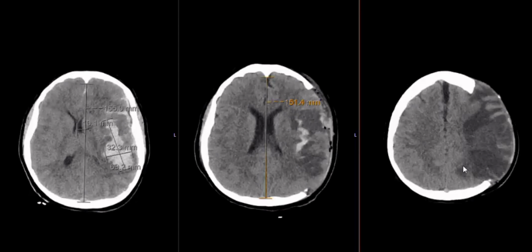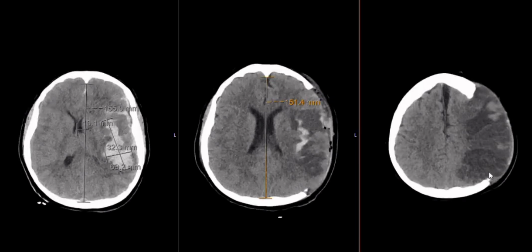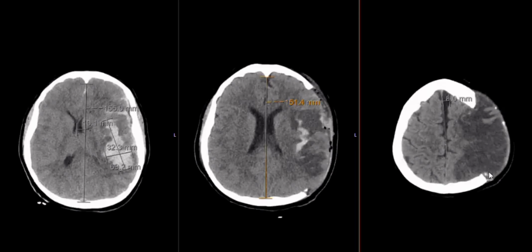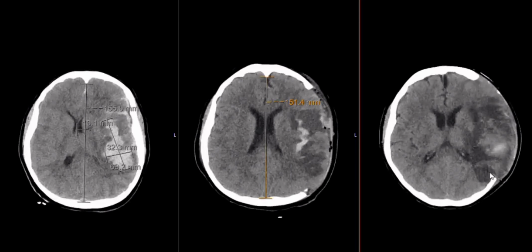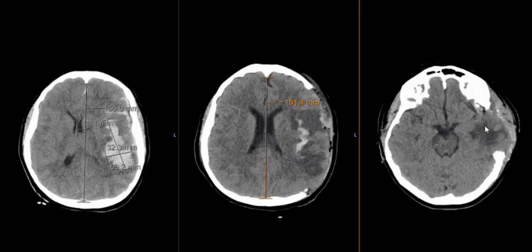We had no folds, some folds, and now more folds to some degree on the other side. But then we have brain that's very much less dense than it should be because there's more water there, more inflammation, likely dead brain cells, but you can't see that here. That is the evolution across time. Yeah. Still some blood in there. That's where they've now done a more intervention, I guess, on the aneurysm.